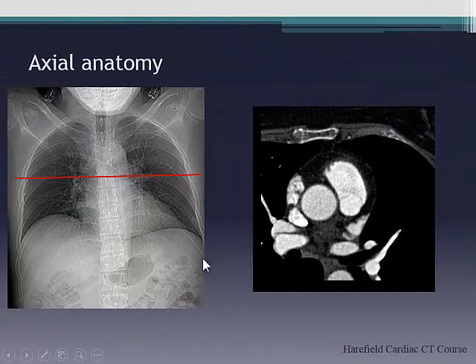Okay, so as we're moving down now, you can see the valve proper. Taryn talked to you about the conus, so you can see that the conus, or the infundibulum, is more a fibrous tissue, so it's thinner before you get into the muscle itself. What you can also see often at this level is the right atrial appendage, which can be heavily trabeculated. I've seen thrombus in the right atrial appendage, so you shouldn't dismiss it outright. And similarly, you'll often get the left atrial appendage just here.